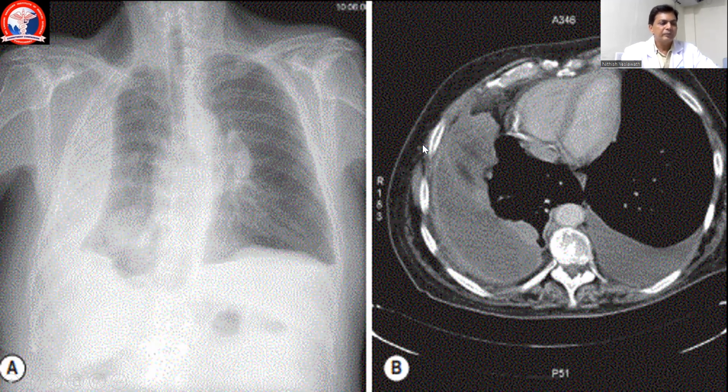So subpleural fat is showing infiltration by an inflammatory process, and because of that edema is occurring in the fat, so that this subpleural space is increased. As well as, this is a complicated pleural effusion, and this is a non-complicated effusion seen on the left side.